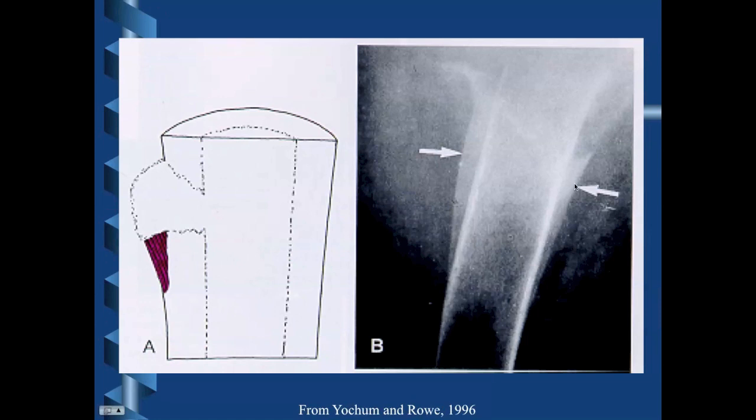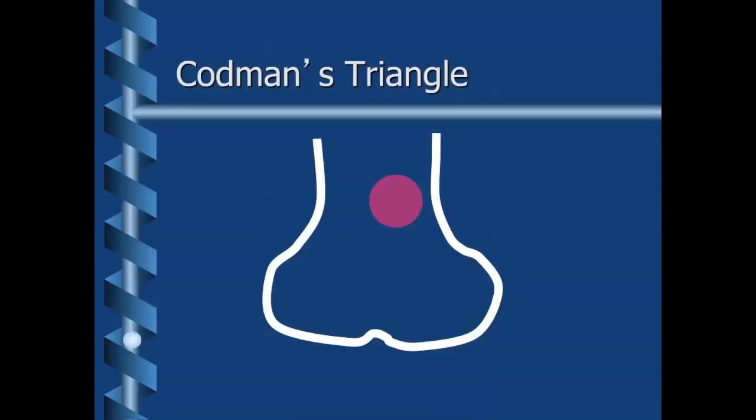In here is just infective material, and basically that's surrounding the bone now. Remember, that's not absolutely specific to bone infection. It can be other lesions, but probably the most likely time that you will see it in clinical practice is with bone infection, particularly diabetic foot ulcers leading to bone infection.